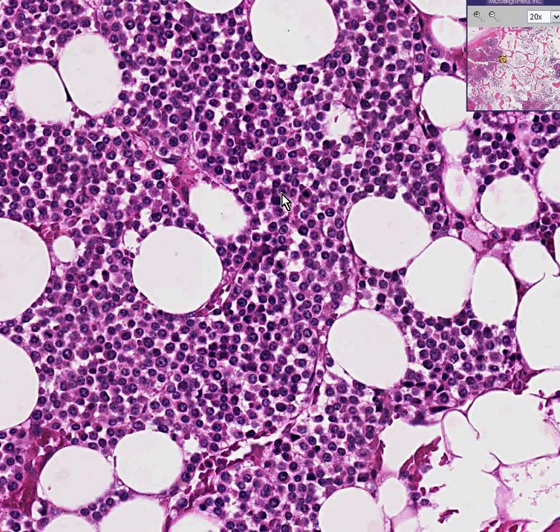They have a round nucleus, sort of peripherally located. They happen to have what they call a cartwheel or spoke wheel distribution of chromatin, and there's usually a prominent hof or clear area in the wider part of the cytoplasm, representing the Golgi apparatus, which is stuffed with immunoglobulin.